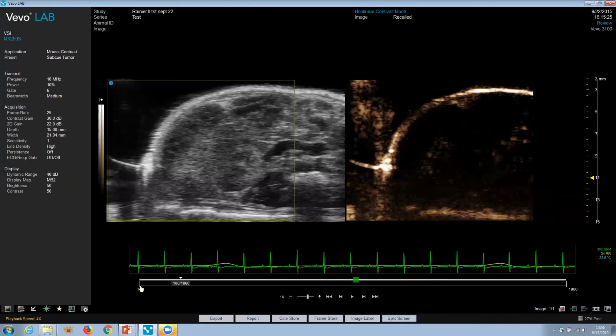What you're able to do now is, if you have a certain specific area within an image, because with certain settings on the system, frame rate, and the size of the region box, you can potentially get up to a Cine loop that maxes out, I think, at up to 10,000 frames. So you have to be selective. You can only analyze a 1,000 frame set.